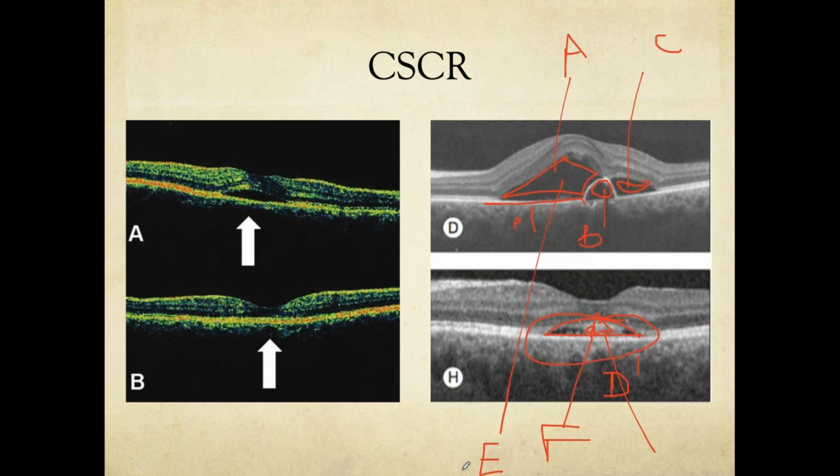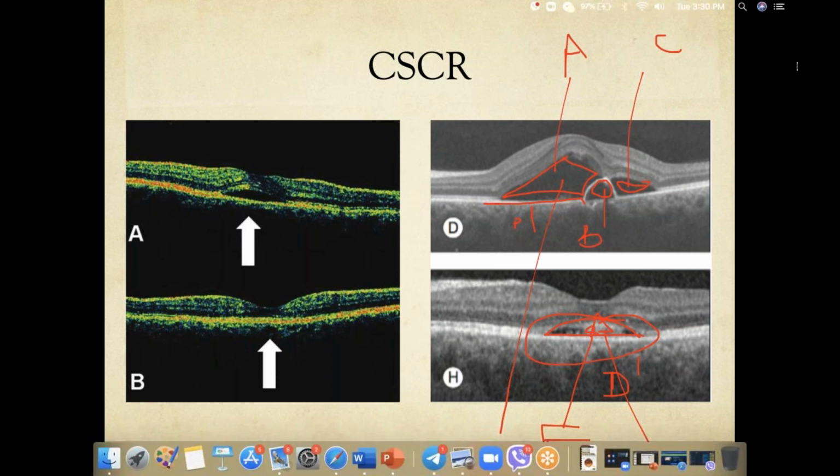Just by showing this OCT, I will not expect you to say this is the exact diagnosis. Even I cannot say that, but I can say that this looks like there is a central serous retinal detachment, but the fluid is not clearly serous. There is also a mixture of some other things which is making hyperreflective material. So it could be a deposit of drusenoid material, or it could be just blood. I cannot go into the diagnosis right away by just looking at this. I need other clinically relevant images.